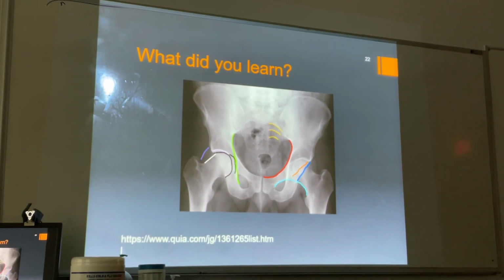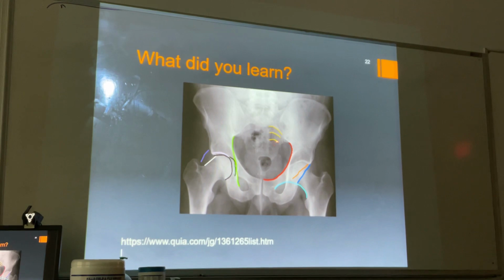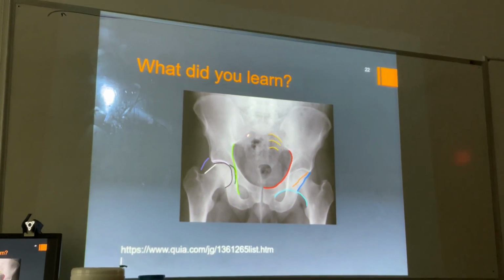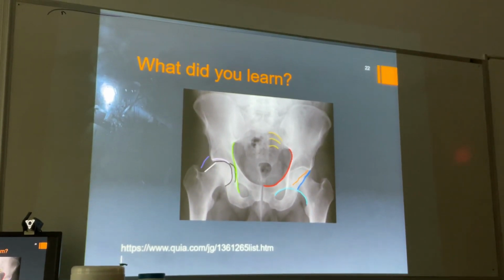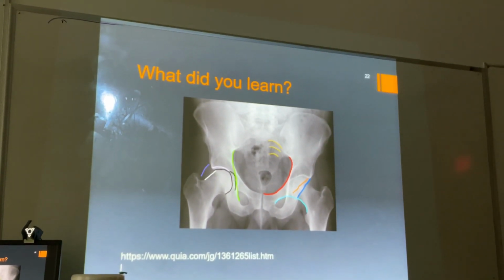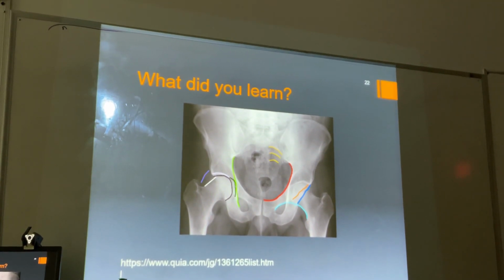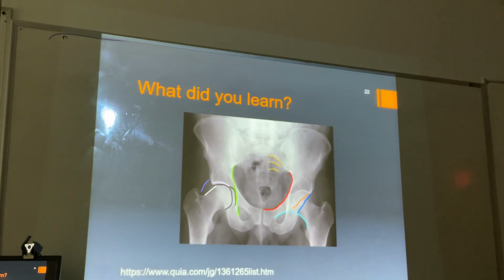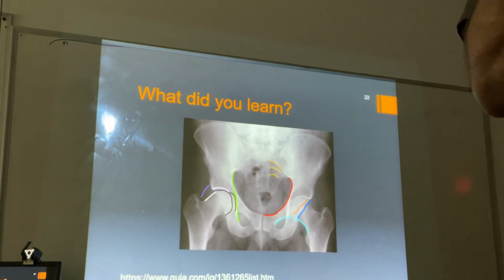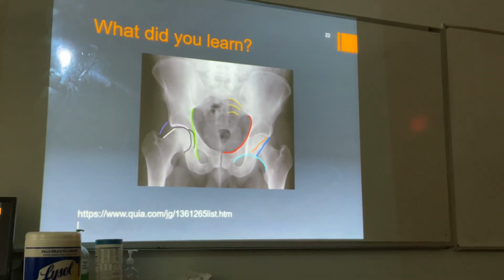Because you didn't think it was important to evacuate the bowel, okay? And now it's filled with gas and fecal material, and there's no way I can see a small sacral fracture, okay? But I've got 2 cases to show you where the elderly patient fell on their bottom, and the anterior cortex of the sacrum is fine until there's a little indent, okay? Not foramina, but the body of the sacrum can fracture. The other thing you can hurt when you fall on your bottom is the back end. What's the back end? Coccyx. Okay?